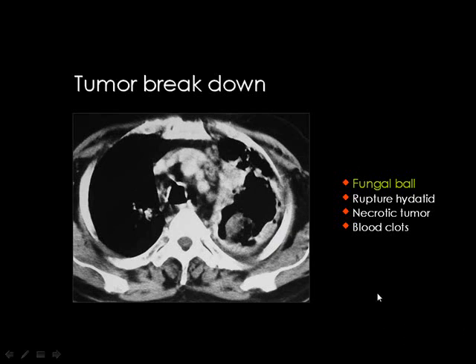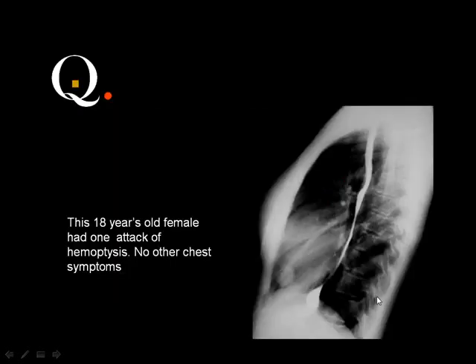Then another possibility of a cavity with a mass inside is necrotic tumor. But the necrotic tumor is originally diagnosed through the major criteria, which are the thick margin and the irregular inner wall. Then we finish with the interpretation, and it came your part in answering the questions.